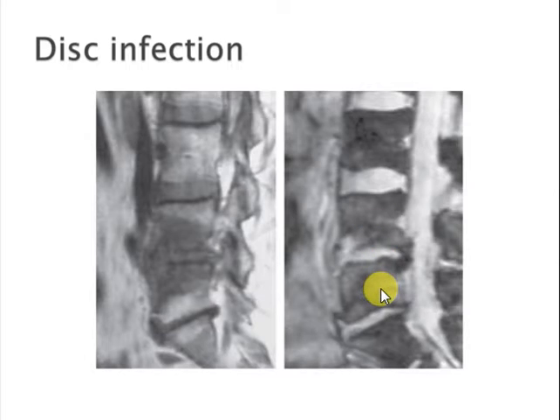This is a very important thing to notice and to differentiate, because Modic changes are just degenerative changes of relatively low clinical significance, while spondylodiscitis is a big issue that needs further evaluation, investigation and treatment. So we should be careful to differentiate Modic type 1 from spondylodiscitis.